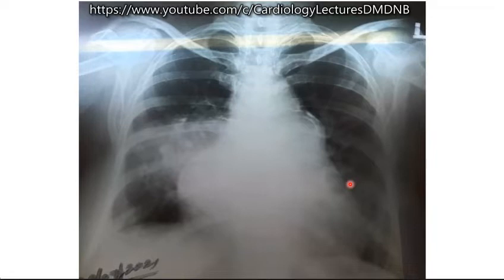This patient is having a PDA, Eisenmenger syndrome, and the left pulmonary artery is not clearly seen. The pulmonary vessels on the left side are significantly rudimentary, and most likely the patient may be having an associated left pulmonary artery branch stenosis. And this combination of the pulmonary branch stenosis with the PDA occurs in rubella syndrome. Very good, Saroj, excellent. So that's how you have to look at the whole thing.